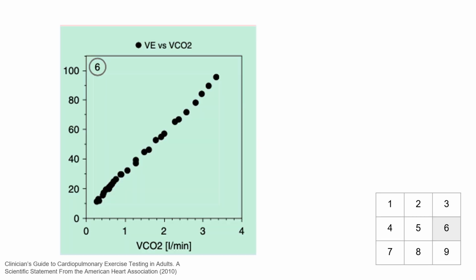Now we'll look for evidence of the respiratory compensation point, or the ventilatory threshold number 2. Here we're looking for the respiratory compensation point on panel 6 that plots minute ventilation relative to VCO2. The slope of this is essentially linear over most of the exercise and reflects overall ventilatory efficiency. Here you can see there's one slope, and then later with maximal exertion, when the available bicarbonate to buffer the CO2 is exhausted, we see there's an upward inflection. And it's at this point of the upward inflection that chemoreceptor mediated hyperventilation takes over and the isocapnic buffering period ends.